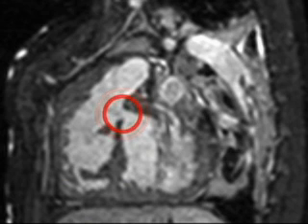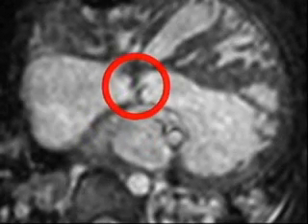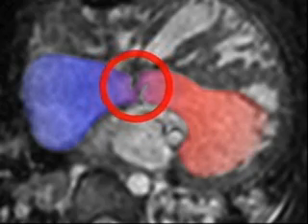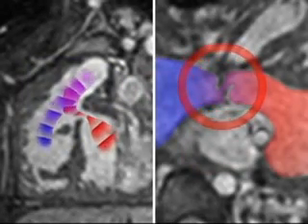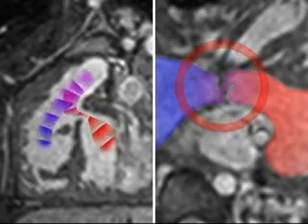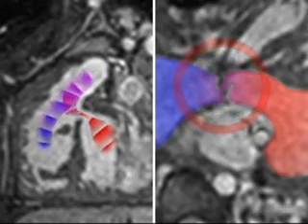The MRI examination shows leakages at two positions in the tunnel. The bigger of the two septal defects is seen in this image. A second and smaller leakage was detected at another location, as shown by this MRI image. It is the surgeon's job to repair these deficiencies. Untreated, they would cause breathlessness, poor weight gain, and an increased susceptibility to infections.